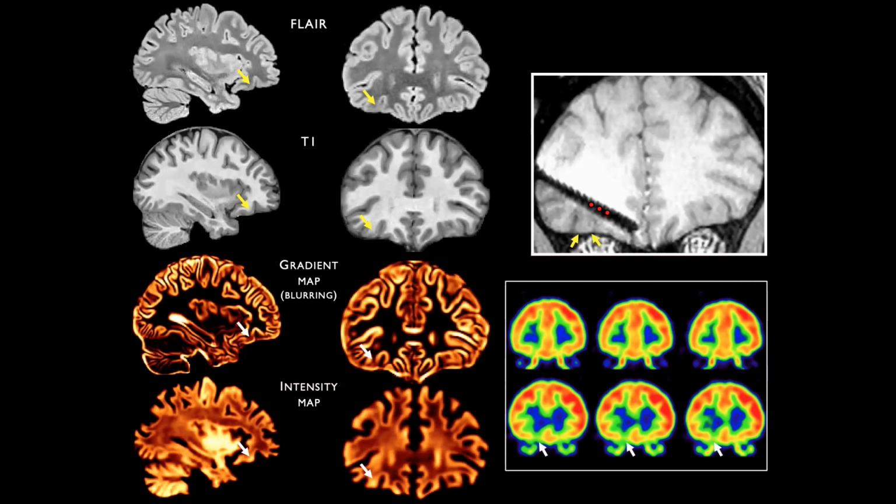Interictal changes were characterized by polyspikes in the mid-contacts of the frontoorbital electrode, shown by these red dots. Ictal changes were seen over the same contacts. Clinically, seizures occurred in clusters with agitation, pedaling, and right arm dystonia, as well as dysphagia. The patient was operated and the histology sample showed FCD Type II.